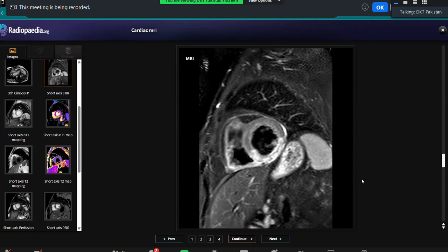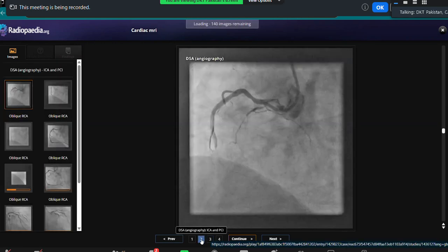They would know clinically this is an acute MI. So if you want to see the coronaries, then this is visible. If you're saying you want to confirm the MI, they cannot confirm it. They will only see the coronaries. Okay, let me show. So, for therapeutic purpose, to remove the thrombus if it is present.